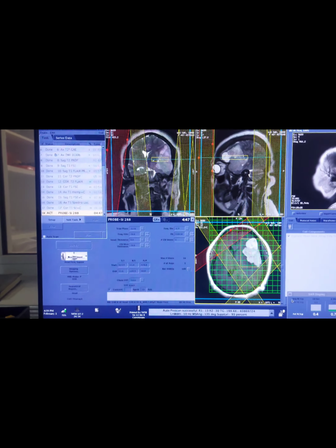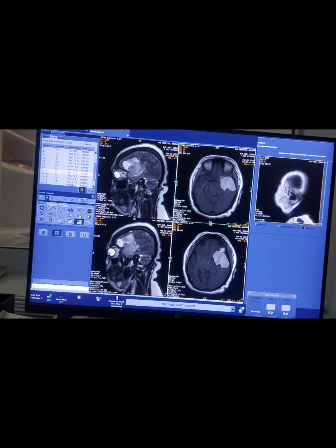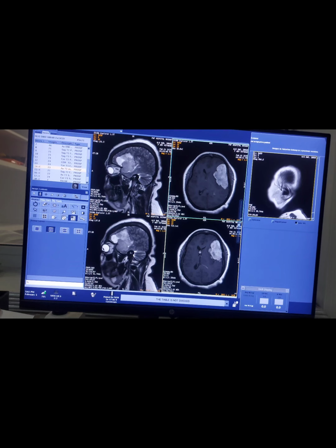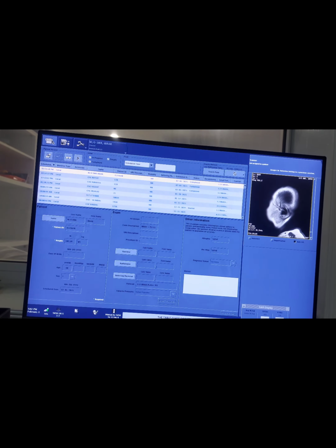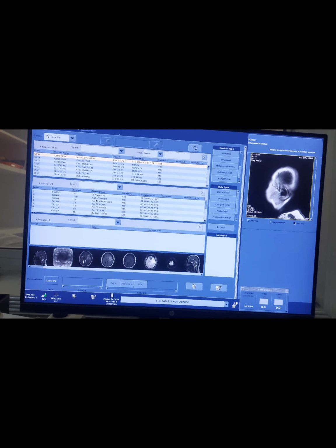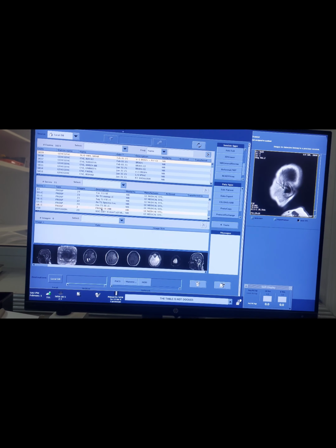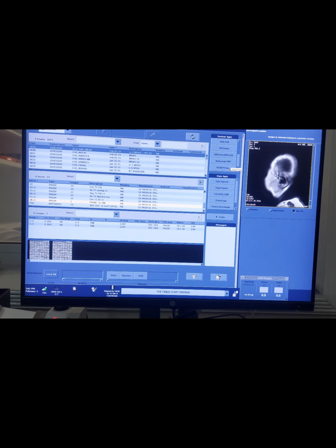While the spectroscopy for this lesion is done, we can see the ratios and levels of different chemicals here. We will select the spectroscopy and open it in the viewer.